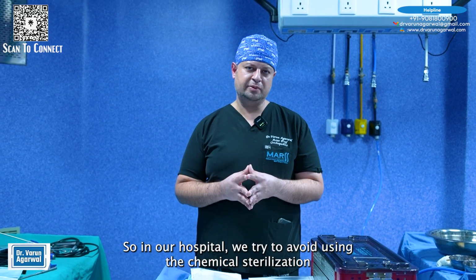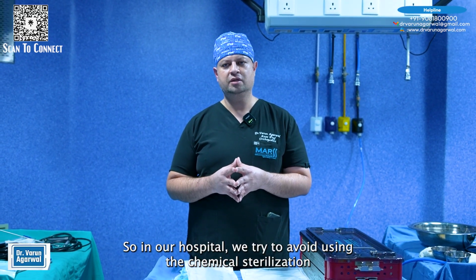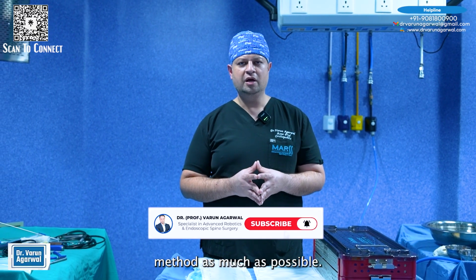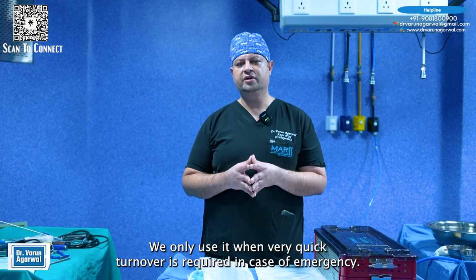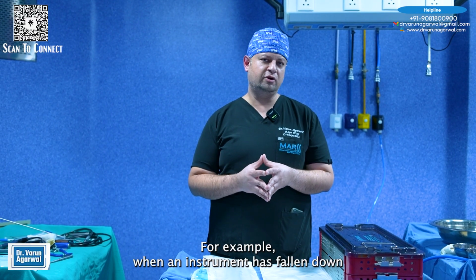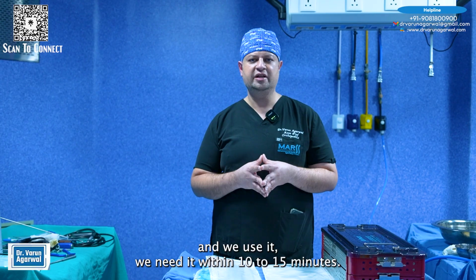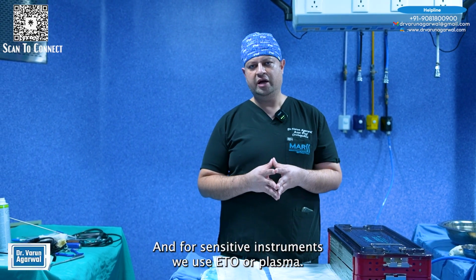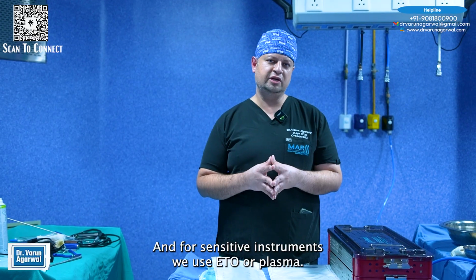So in our hospital we try to avoid using the chemical sterilization method as much as possible. We only use it when very quick turnover is required in case of emergency. For example, when an instrument has fallen down and we need it within 10 to 15 minutes, but usually our workhorse is an autoclave, and for sensitive instruments we use ETO or plasma.